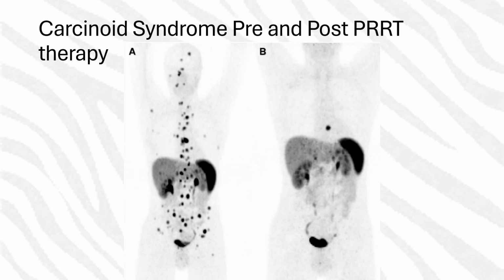And that's really it. So this patient had a pretty good response to the lutetium-177 therapy, but they did still have at least one area there. This scan would become the patient's new baseline, but this patient would also need an FDG study as a baseline and to make sure that the tumor has not progressed at all.